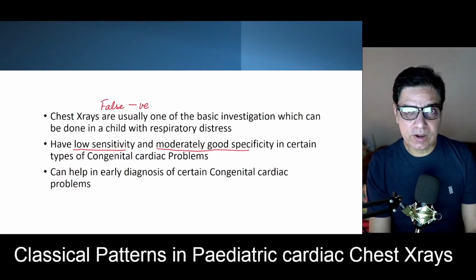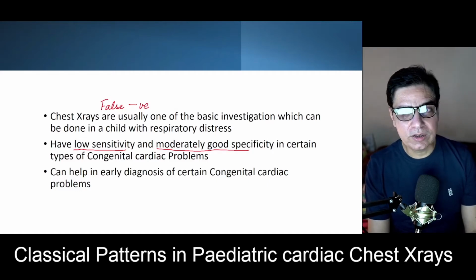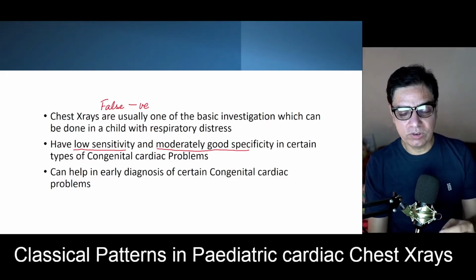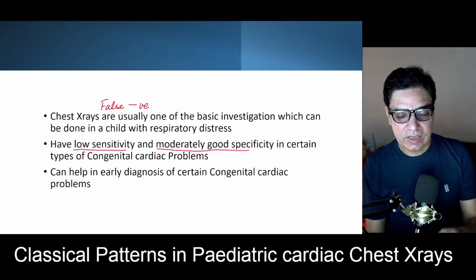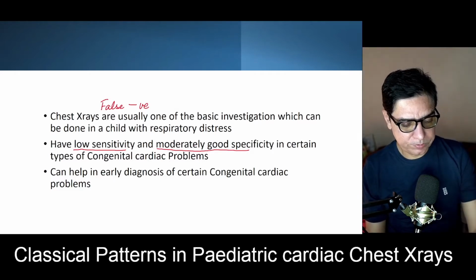And if you are lucky, you might come across scenarios where you will get those classical signs on chest X-rays which are reserved for particular cardiac diseases. So in this lecture, we are focusing on some of those cardiac conditions and their characteristic chest X-ray findings, which you might come across in your pediatric practice.